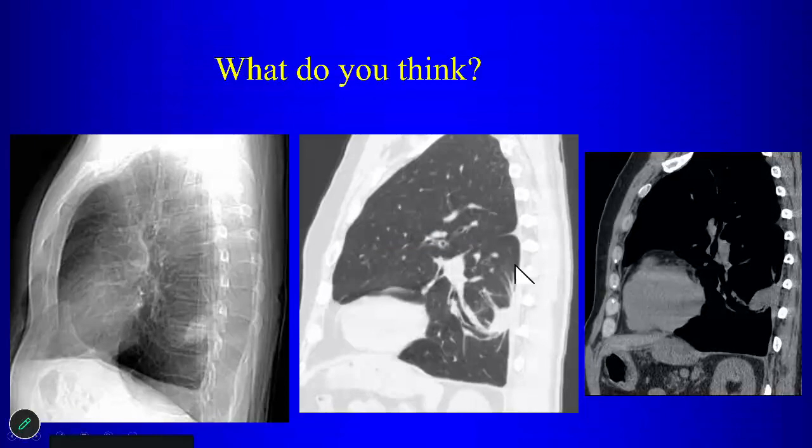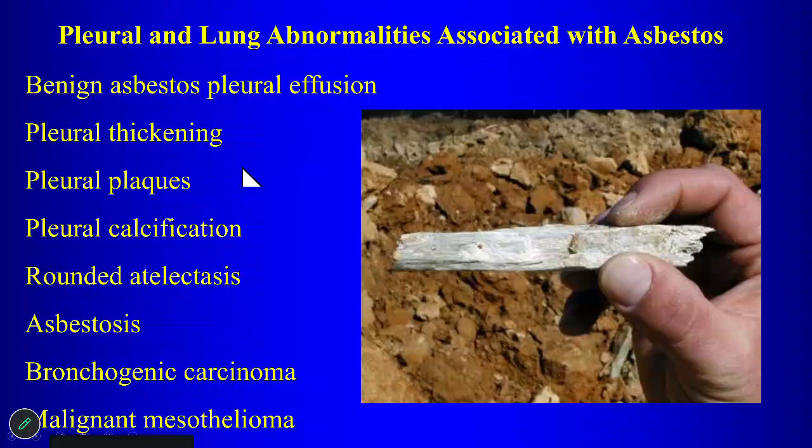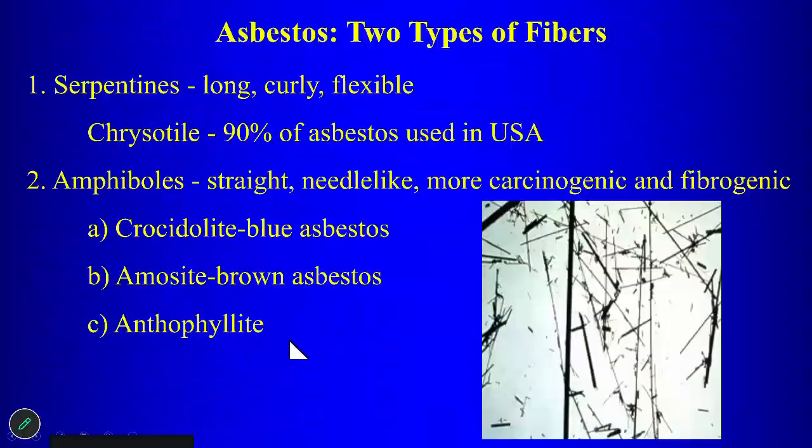What else? So comet sign, the vessels rolling towards the lesion. What are the other findings associated with it? Pleural thickening is abnormal pleura. It's pleural based. It's an area of abnormal pleura, right? Comet tail sign, and look at the position of the major fissure. Why is it there? Volume loss. Those are the findings associated with round atelectasis. This can also be a manifestation of asbestos. So all of these things we can see with exposure to asbestos.